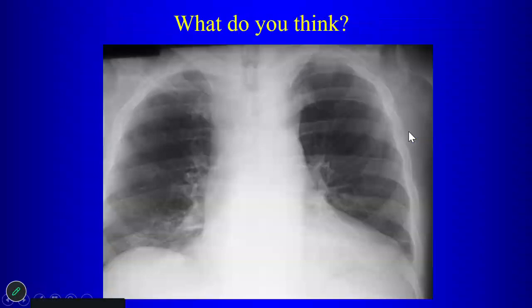Let's talk about now more diffuse mediastinal abnormalities. Here there is widening of the mediastinum, but it's very smooth. You see, there's no lumpy bumpiness, no lumps, very smooth widening of the mediastinum. What can do that? Pulmonary edema? Pulmonary edema gives you vascular engorgement, right? It doesn't give you smooth widening of the mediastinum.